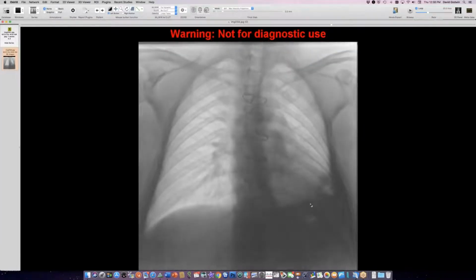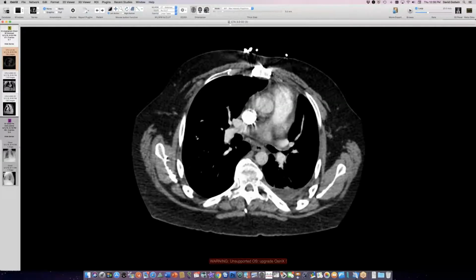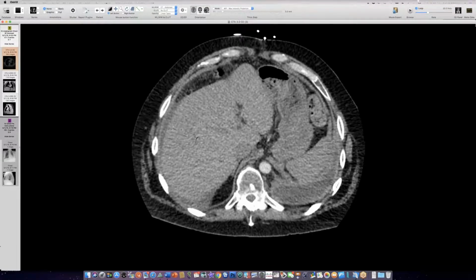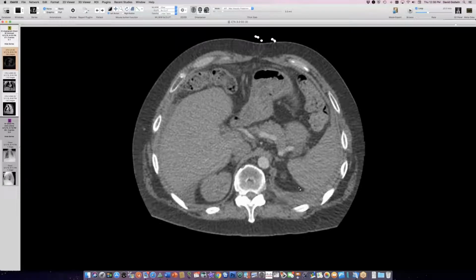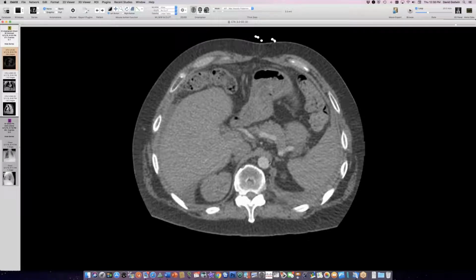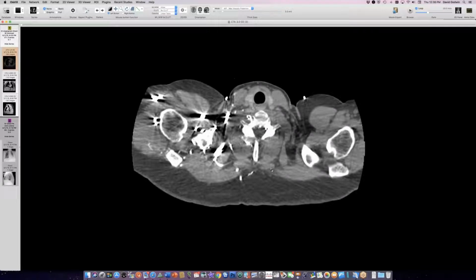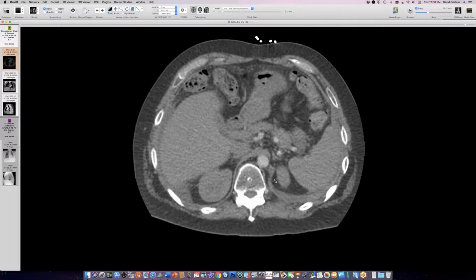So this is tethering. Let me go back to the CT to show you that crus thickness was normal. There wasn't any sign of wasting of the crura. As a matter of fact, if you've got tethering like this and restriction, you can actually hypertrophy your crura by the muscle having to work against that resistance. So you see we have good muscle thickness here of these crus bundles posteriorly. So we don't have atrophy here, but we have restriction, in this case caused by tethering.